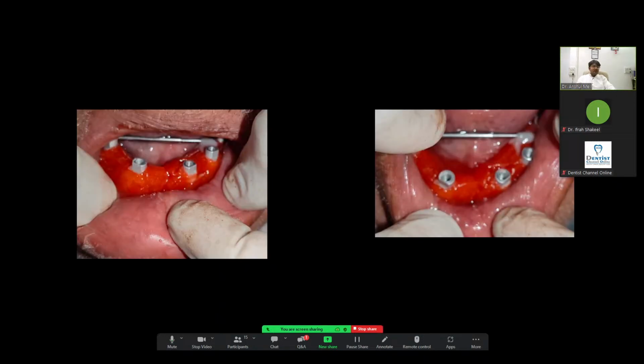So that's how we are doing it nowadays for cases when we have a full arch. There is no need for three appointments, and no need to wait for my digital model. Once my physical model is ready, it's already fitting. But if I want the digital model, once my model is ready, I can check my jig on top of that also. So I have one more provision: I can cross-check on my model as well.